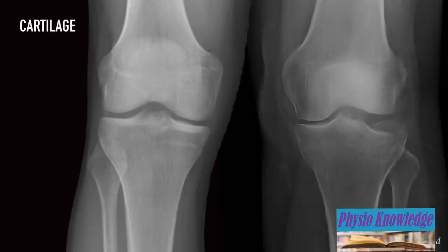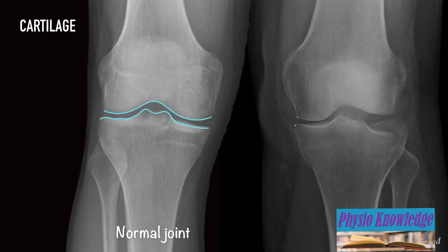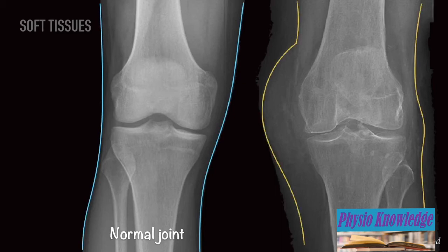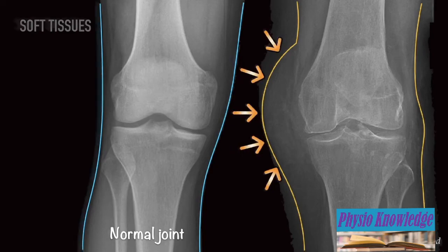Cartilage applies to examine the joint spaces on the radiograph. Widening of the joint spaces indicates ligamentous injury or fractures. One must not miss the soft tissue swelling and joint effusions. These can be signs of occult fractures.